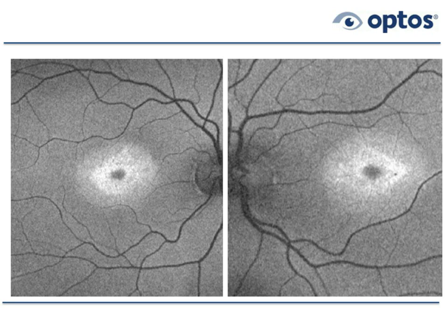That's because the Plaquenil seems to have an affinity for the retinal pigment epithelium, and by stopping it, it doesn't get rid of the drug at the level of the RPE. So think in terms of these bullseye lesions as possibly being due to Plaquenil. If the patient's not on Plaquenil, but some other drug, like Accutane, we've seen this in Accutane toxicity as well, but let's say the patient has not been on any drugs whatsoever. This kind of a pattern, a bullseye pattern, can be a cone dystrophy, it could be a cone rod dystrophy, it could be Stargardt's disease.